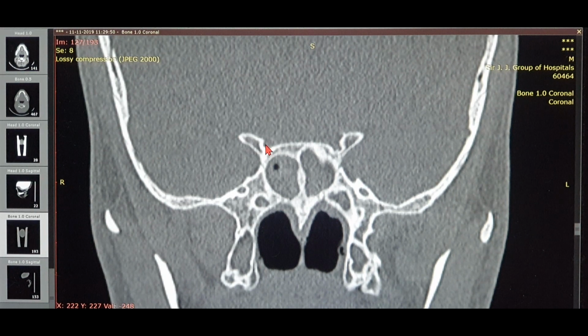So one more viva question from the examiner. Similarly, you can see on the lateral aspect of the anterior clinoid process. Now, this is the anterior clinoid process over here. This was the optic nerve. Similarly, you can see a huge C-shaped concave depression over here. That is nothing but the carotid artery, the internal carotid artery indentation. So this is the optic nerve, this is the ICA, this is the sphenoid sinus. So that's it. You can show the examiner the carotid artery.